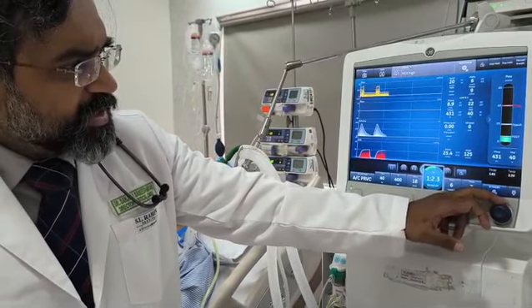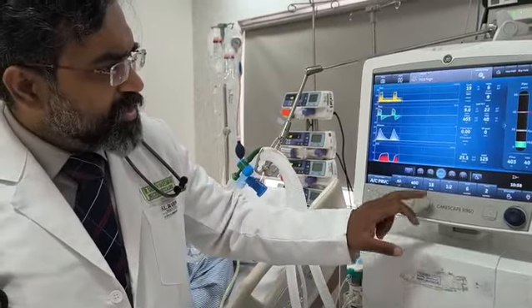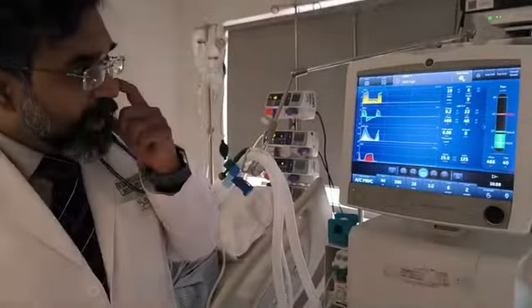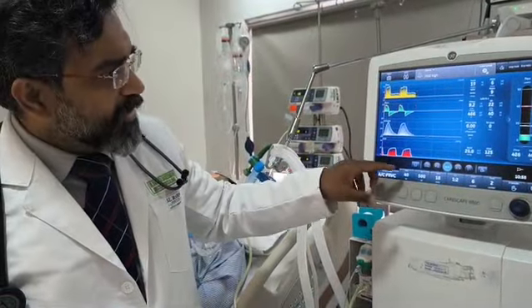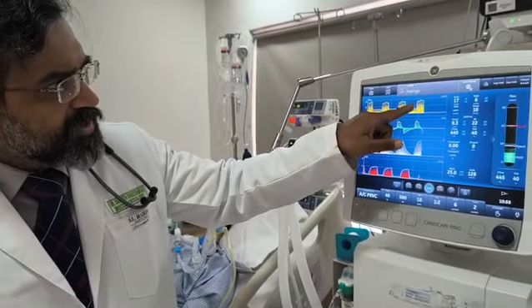It doesn't harm anything. It is just a pressurization of the circuit that is changing over here. If I were to increase the tidal volume also, the pressurization remains the same. So in fact, it may get amplified. So let's see. 500, it's actually seen there. Okay, it's still seen there.